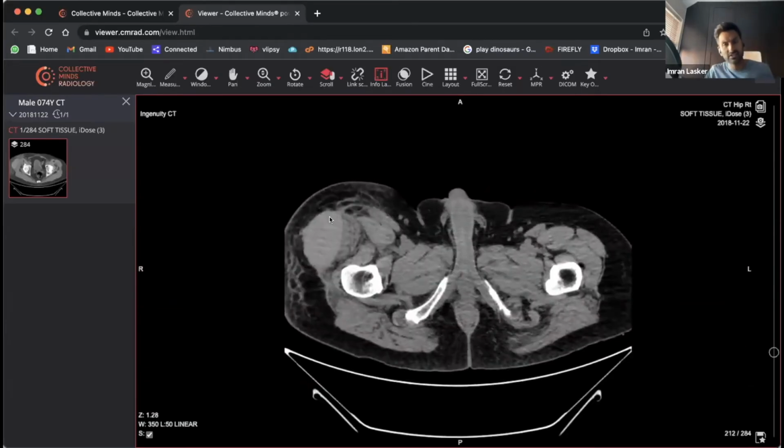So this is something called Morel-Lavallée syndrome, I guess, or injury. What's happened is that you've got a fascial plane between the musculature and the underlying subcutaneous tissues. This patient skidded, so a bit of skin was stuck on the pavement, and it pulled everything away from the underlying musculature, and you get this shearing injury. Because of that gap, it starts to bleed, giving this crescentic appearance of hyperdense material. So this is actually hematoma.